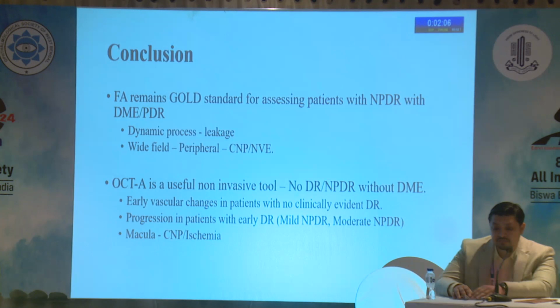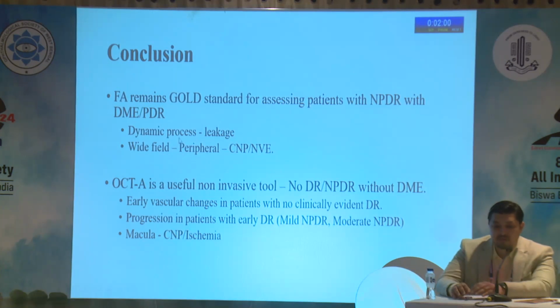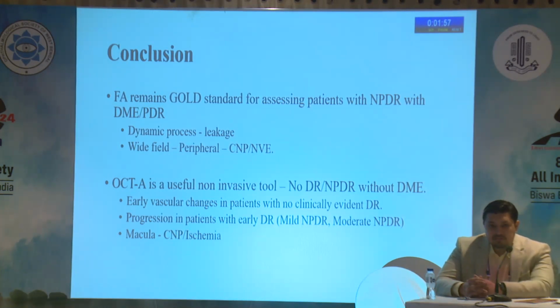So another advantage of FA is that it is a dynamic process. It tells you about leakage from the phases which are there in FFA. It does tell us something about what is happening to the flow inside the retina.